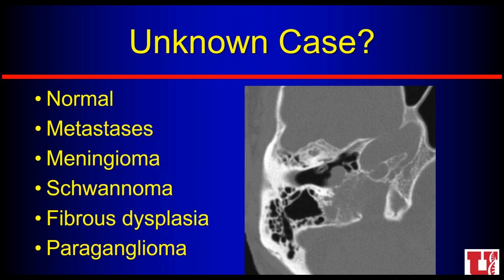And if I have a CT, I don't feel bad about recommending an MR, because I know if I have both, I'm much more likely to tell you exactly what the pathology is. There's a lot of different things we could think about at this site, and we have a lot of differentials we think about on imaging. So here's one pathology case.